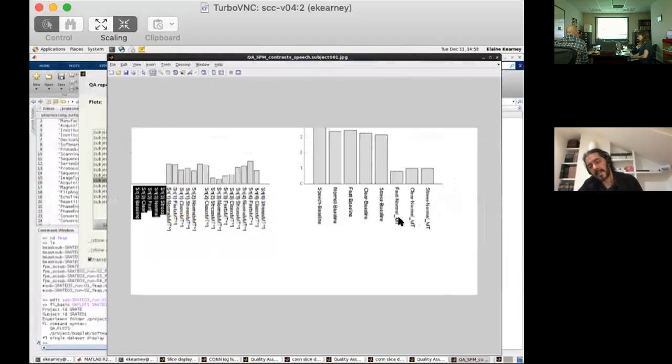Oh, okay. So the last 3 are the ones that are comparing different conditions, and the first contrasts are the ones that are comparing something to baseline. That's right. The movement time is as well. Okay, that's fine. I mean, that's expected as well. That's not overall though. If it's a value that's below 1 there, that's probably not great. Right. I mean, this is telling. Let me see if I recall.